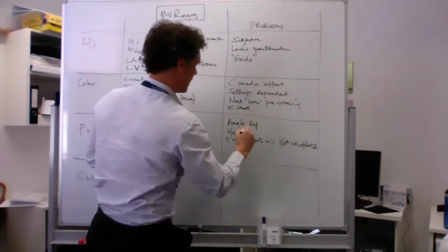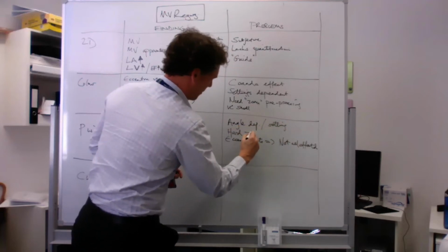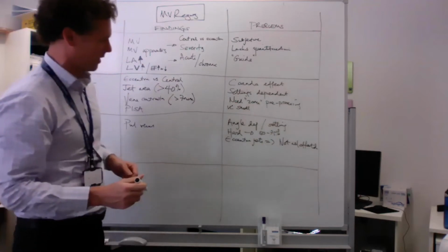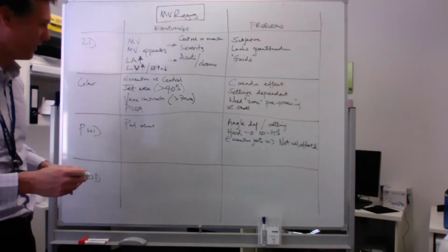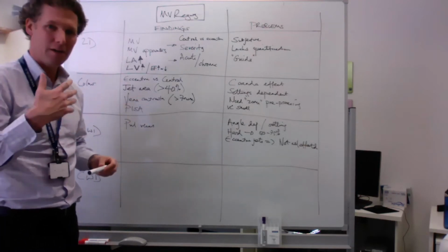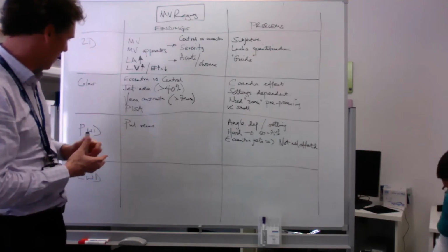Angle dependent, settings. I reckon I probably do it in about 50 to 75% of patients if you're lucky. I'm probably more in the 50 category, maybe our sonographers are more in the 75. We've got a couple of sonographers here who are really amazing at it, and it can be a really useful thing to have in your assessment of these patients.